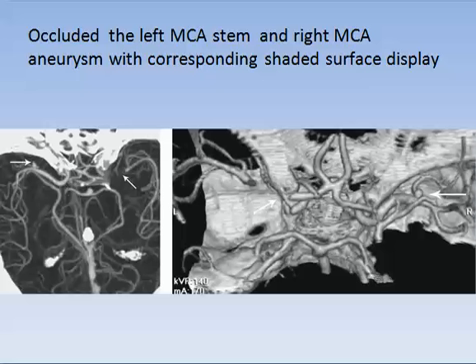Here we have non-filling of the left middle cerebral, occluded left middle cerebral stem, and a right MCA aneurysm. This is a shaded surface display, showing the aneurysm here on the right side.